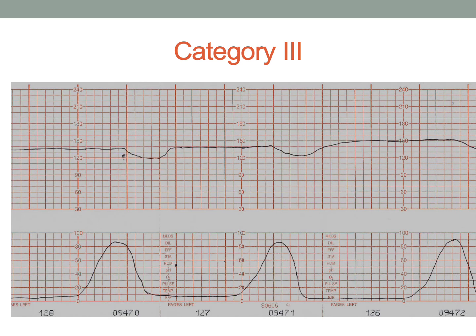Now, if I had this same exact strip, but I had moderate variability, it would not be a category 3. Or minimal variability, let's not say moderate. Minimal variability, it would be a category 2 that I would be performing interventions on, because I need to make sure that it gets out from there, or that the late deceleration stops happening, because if not, it's quickly going to become a category 3. And again, we'll talk about interventions in the next presentation, intrauterine resuscitation.